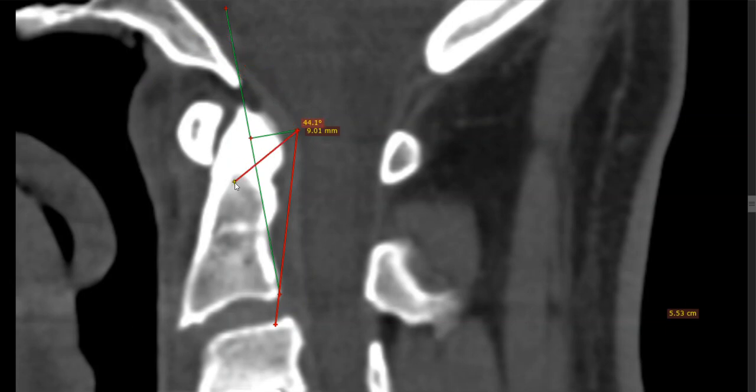So I'm going to actually follow the dural path. What I mean by that is I'm following the front of the dura and following your brainstem. Normally with this axial angle view. Okay, I'm going to move this so I can actually function. Keep this guy here. And what I'm going to do, because CAT scans are slightly off with what you're trying to look at, I can get that guy right back here.